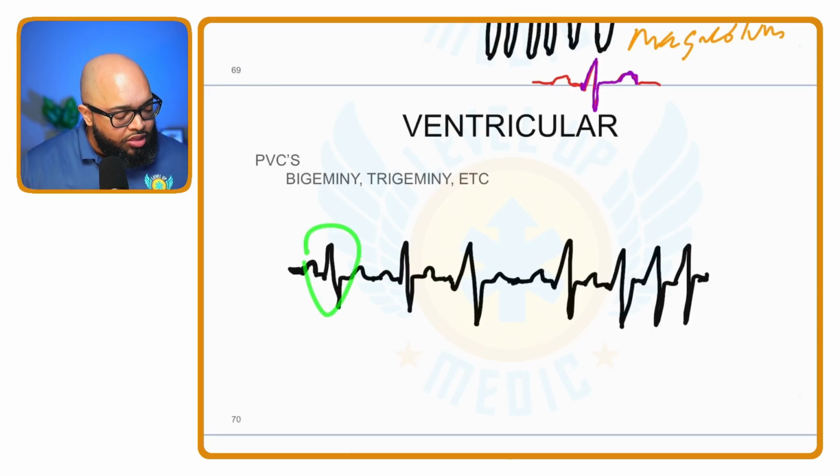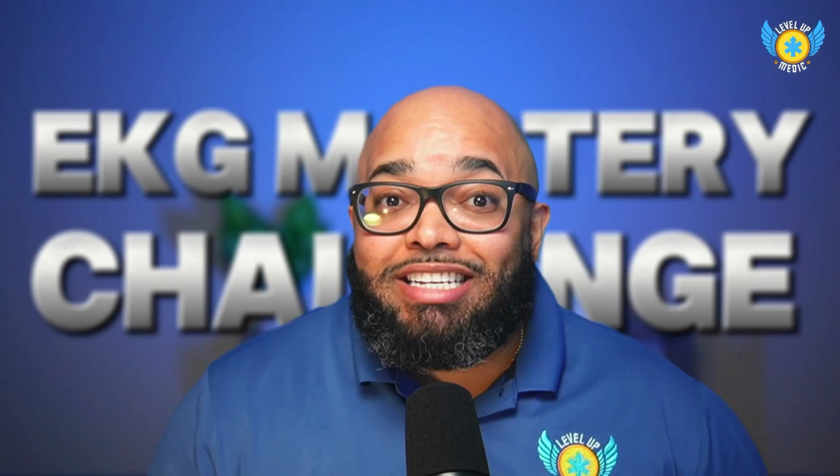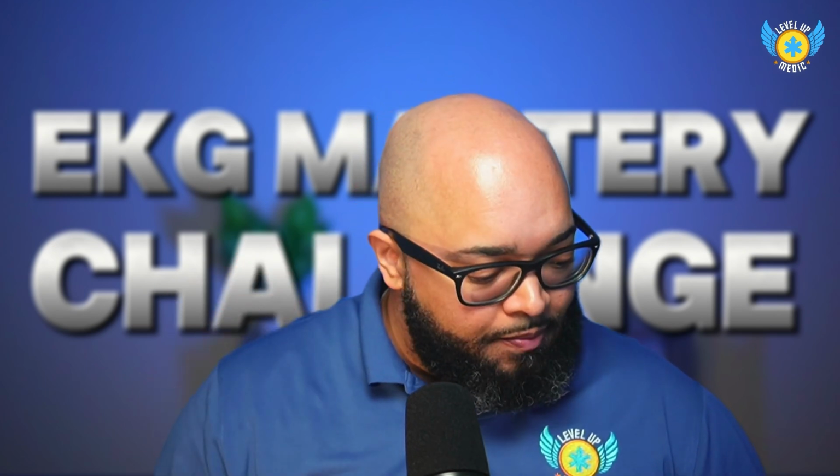So we have a normal rhythm, let's say a normal beat, and then we got this funny situation here. Notice that the normal beat has a normal QRS. A normal QRS is how long again? Within 3 little boxes, or within 0.12 seconds.